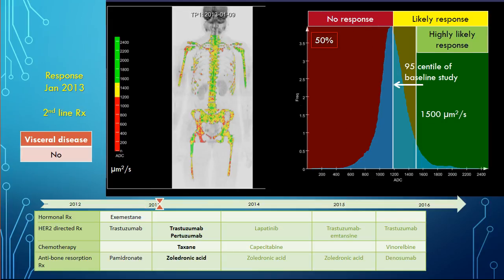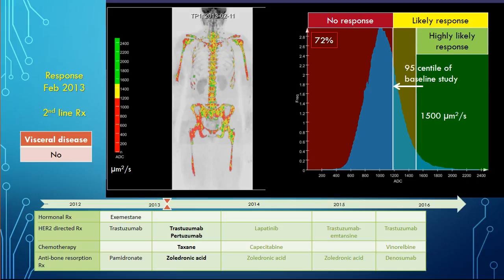So we switched her to pertuzumab, Herceptin, and a taxane. And what we observe is a great response to treatment. About 50% of the tumor shows some response. On her next scan, we can see she's beginning to relapse. The relapse appears to be occurring in the region of the right hip. You'll remember that this is where we first gave her radiotherapy.